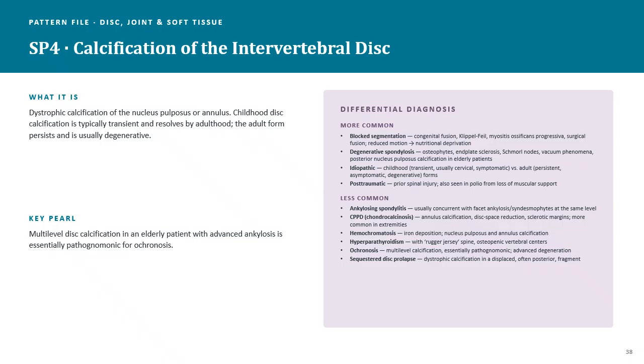When we also see this calcification, we see a portion of the spine that hasn't been, I'll say, moving like it normally should. So for example, if the vertebrae is fused together congenitally, meaning they were born with that fusion, or surgically, that's going to alter some of the movement of the patient, and it can contribute to some of these calcifications in the disc.